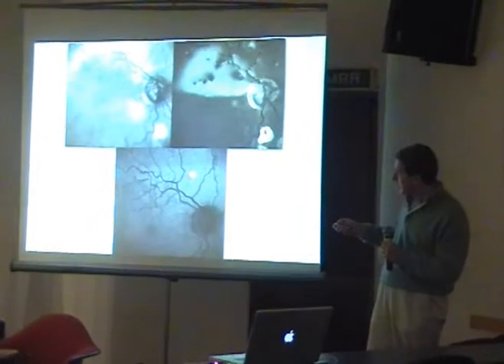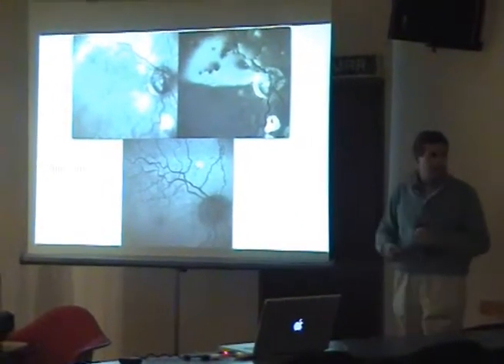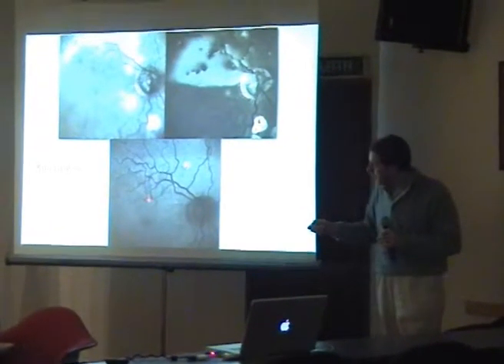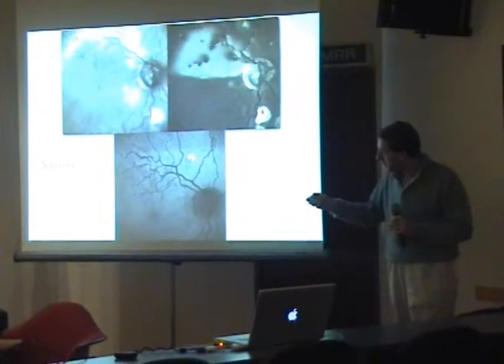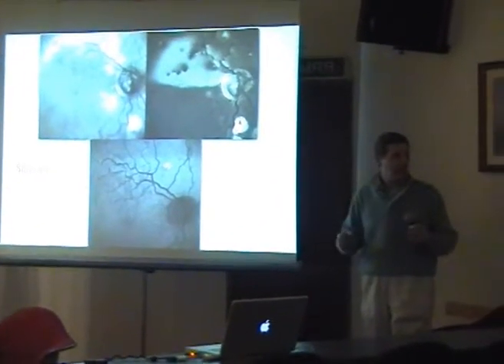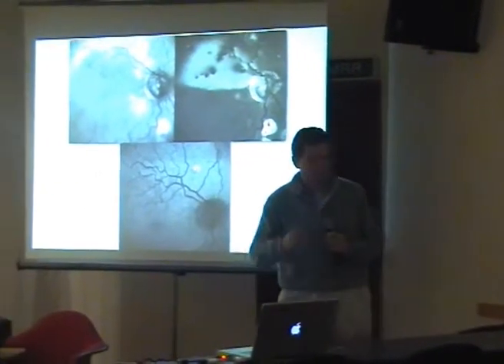It's typical, and these small bubbles, fluorescent bubbles, sometimes are confusing because they can be concentrated in one point or diffuse in all the retina, and sometimes it's not clear exactly what type of disease it is.